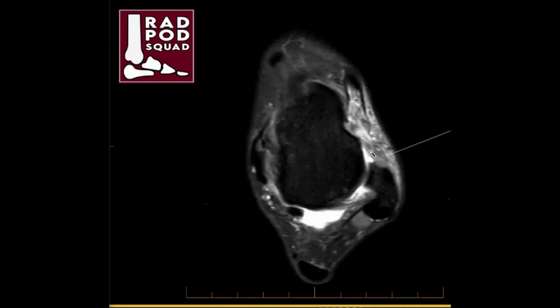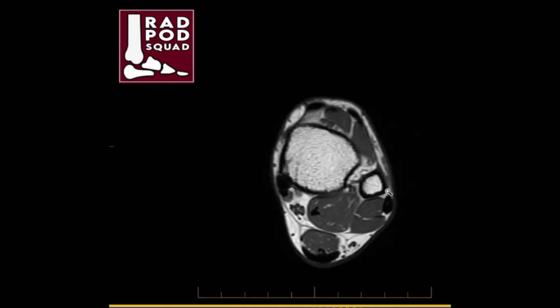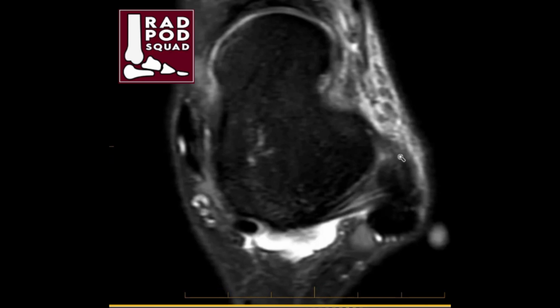Moving past that region, now we get to the region of the anterior talofibular ligament, and notice I have an irregular ligament, the fibular attachment also slightly more frayed. When we look at this under T1, we can see the irregular changes along the bone, the early pull along the bone, the stress-related change. Bringing it back up to our axial images, I would call this a sprain/partial tear because it has laxity to it, and that's the rest of the ATFL.